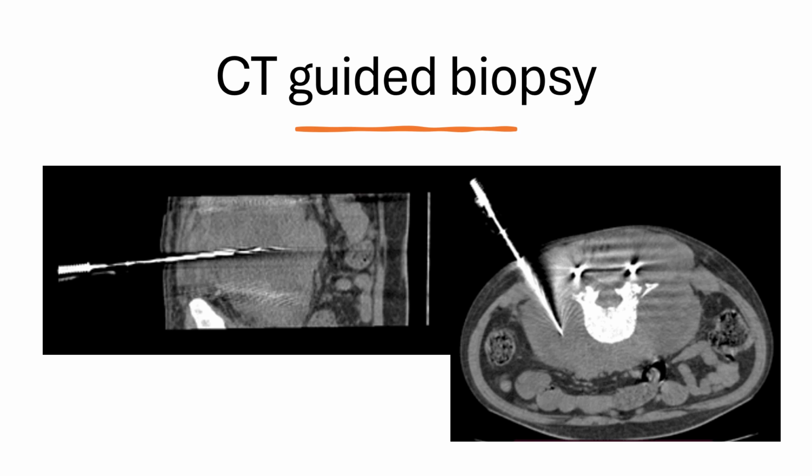And for confirming the diagnosis of lymphoma, a CT guided biopsy was done from the psoas region, which confirmed it to be a lymphoma. So imaging helped in the diagnosis of this patient.